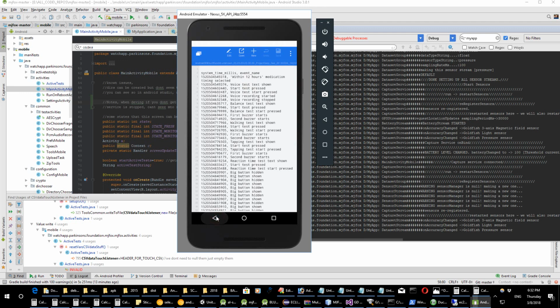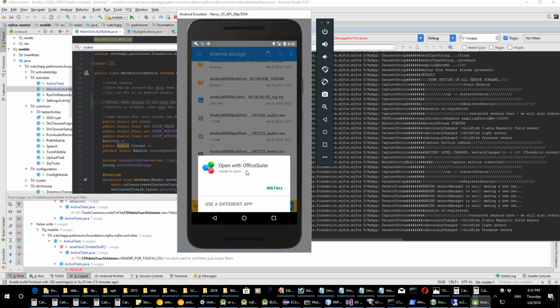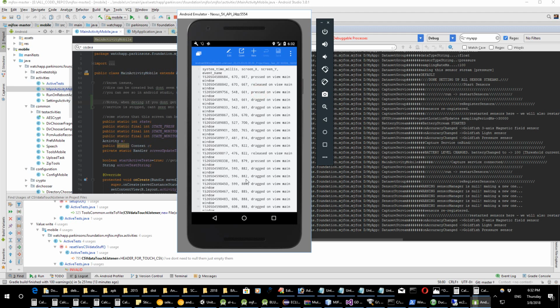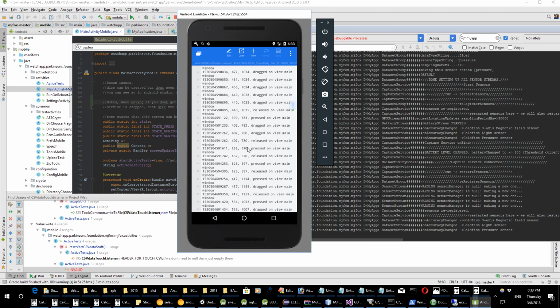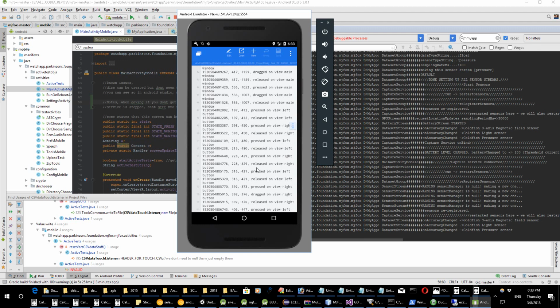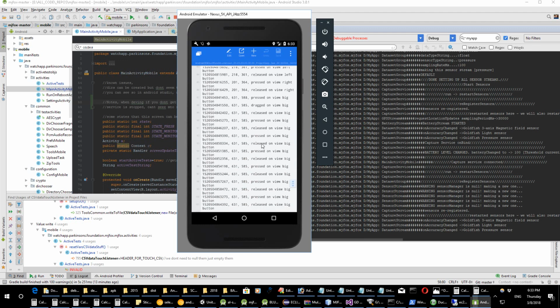You see the touches in this one, which is touch. So they can correlate using software the touches and the events. It would look a lot neater on a wider screen, but basically it's just events and when they happen. So you can see when I did press on the big button, for example, there.